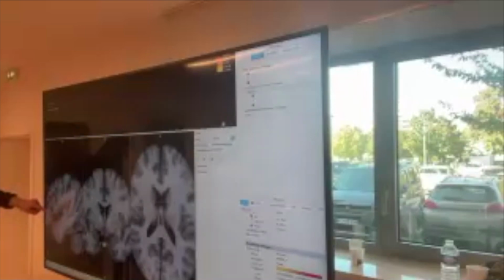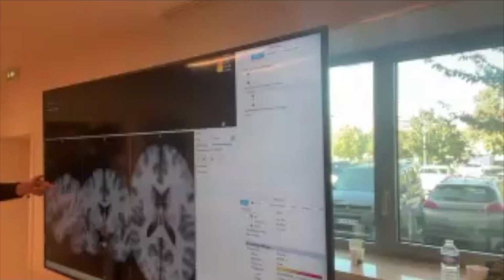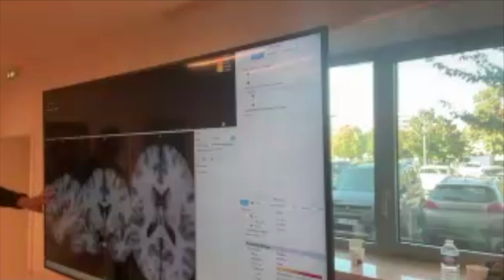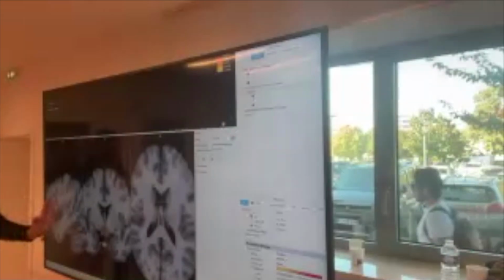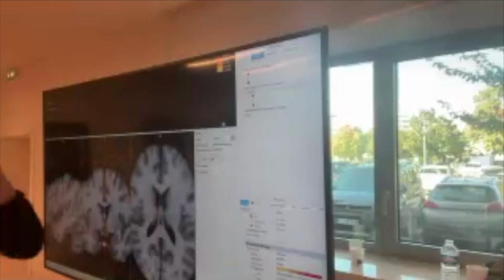Plus, you see this sulcus here. Any idea what that is? Central sulcus. That's the central sulcus. Super. What is the gyrus in front of the central sulcus? Precentral. Fantastic. In terms of functions, what does it do? Motor, correct. So we know the arcuate fasciculus reaches the ventral precentral gyrus. So we're going to place a region that covers the ventral precentral parts of Broca, and a second one posterior to Heschl's gyrus. Good? Okay.